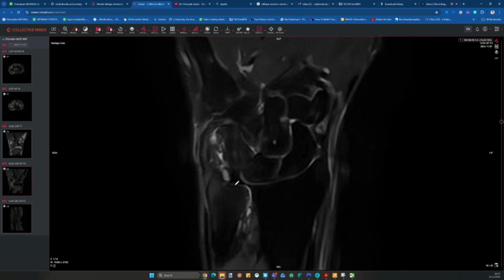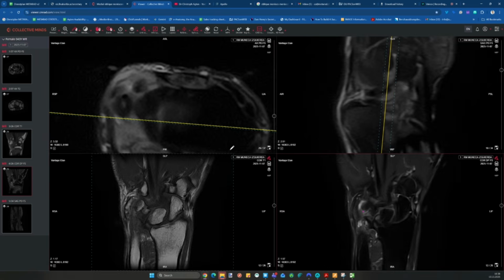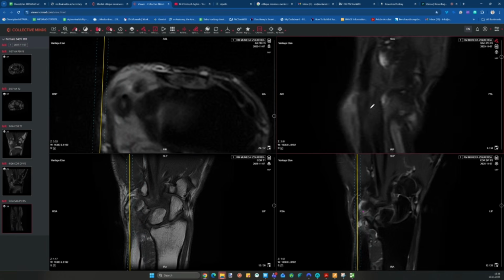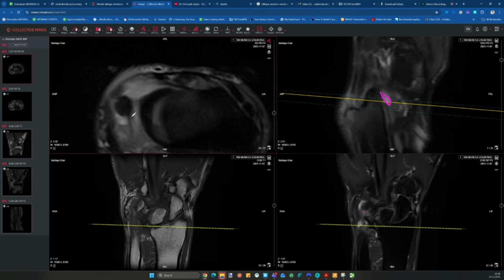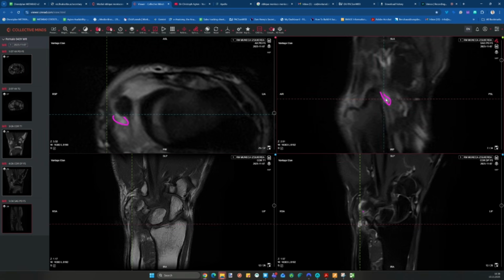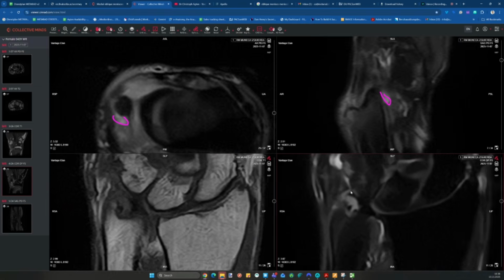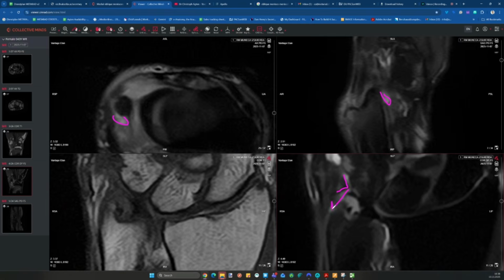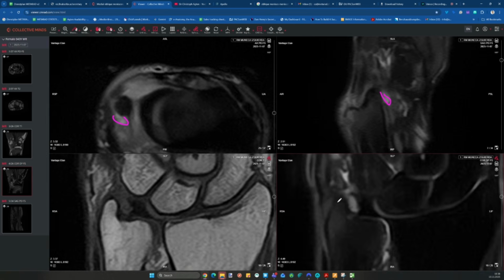I don't see a tear. And I think the second thing on the volar aspect that you mentioned, there is also some edema, we can see a little bit here and a little bit here. I think one of them will be the pre-styloid recess. I think this one here for me would be the pre-styloid recess. So this is just a pouch of the joint space. Here you can see the meniscus homologue, and this is where the pre-styloid recess goes down. I think this bulges just down here volarly to the styloid process.